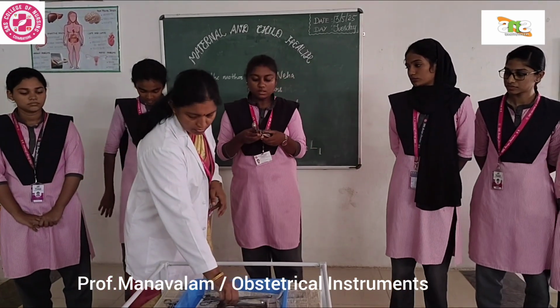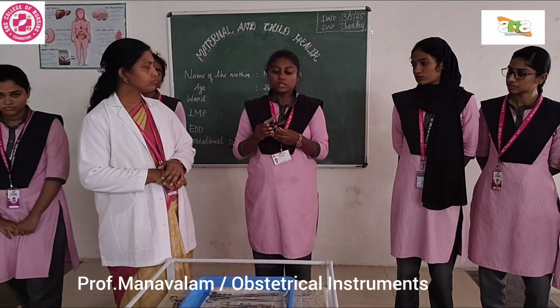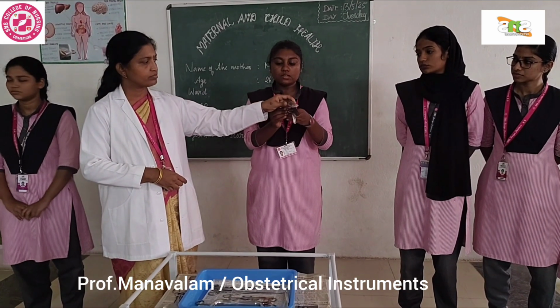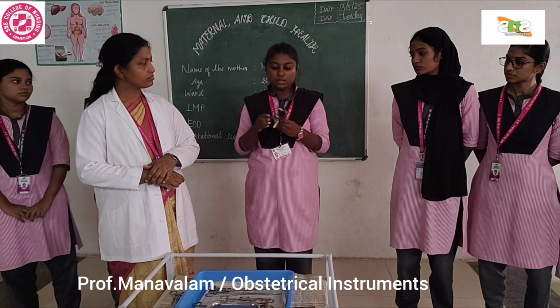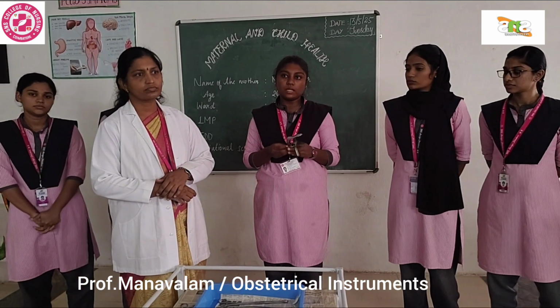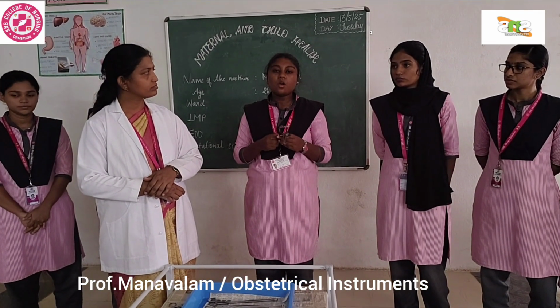This is called Cusco's bivalve self-retaining speculum. It has two specialized blades which are concave in shape. It also has a specialized screw and a holder, so they don't need an assistant to keep it open. It is used for visualizing or inspecting the vagina and cervix, and also for collecting smears for cytology.